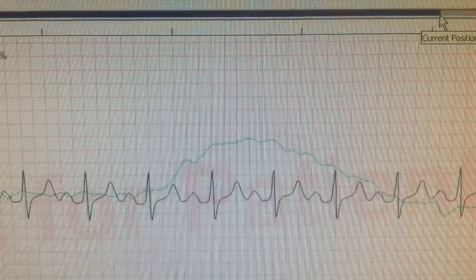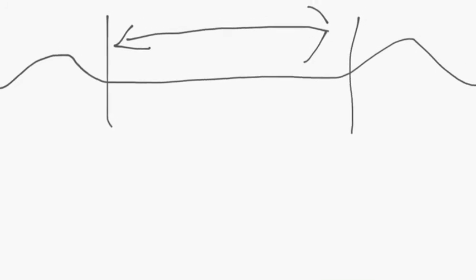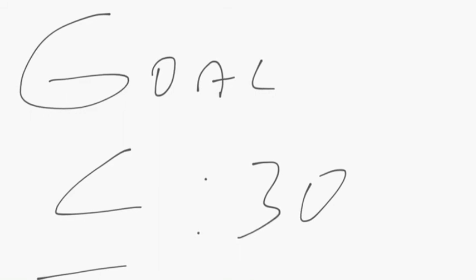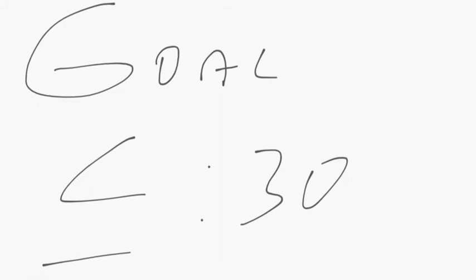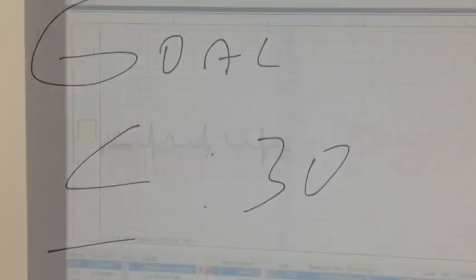So as a core measurement here at Hillsborough County Fire Rescue, we measure that time when we are not ventilating. And again, we call that the apneic window between the last breath or ventilation and the first ventilation that we provide for the patient. So when you review your impedance channel data, you're going to look at the period between your last breath or ventilation and the first ventilation you provide for the patient, with the goal being that that window is less than 30 seconds. So how do you succeed at this in the real world and keep this core measurement to under 30 seconds?